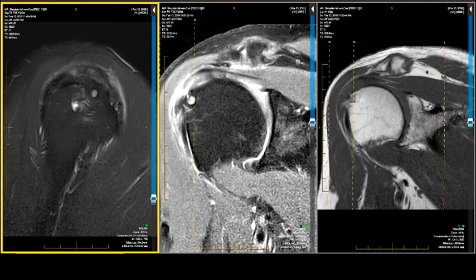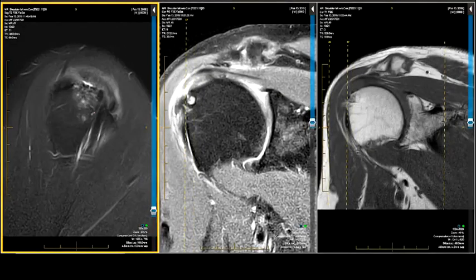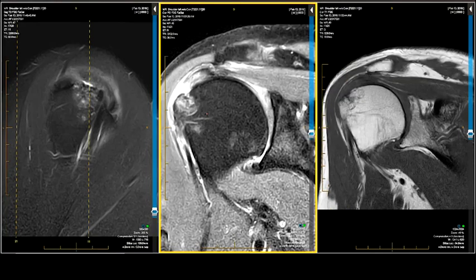It can also be your enemy. Why is that? Well, what's the signal of a tendon or a ligament? It's black. What's the signal of scar tissue? It's black. So what happens if you have a scar, tendon, or ligament connected and somewhat straight? You're going to read it as intact, even though it's really a false connection. Happens all the time. So you can't simply rely on the T2 to make the appropriate diagnosis of a partial tear, a full thickness tear, etc.